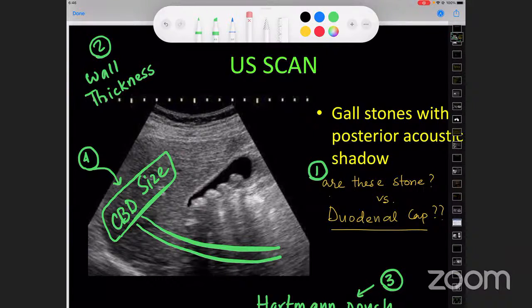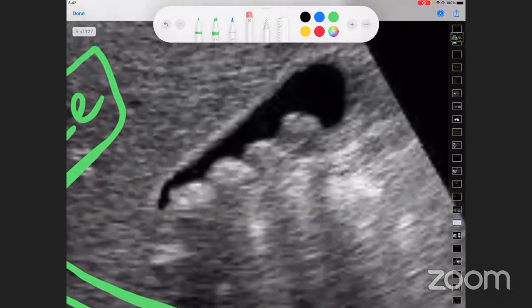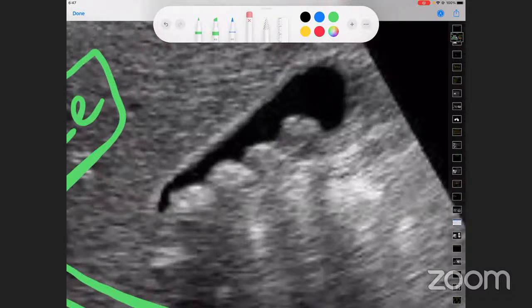You want me to tell you if there is a stone inside the gallbladder or not, number one, and how many stones there are, and what is the average size of the stone. Sometimes when we see a single echogenic lesion, probably at the neck region of the gallbladder, we always turn the patient to the left lateral decubitus to see the mobility of the echogenic lesion.